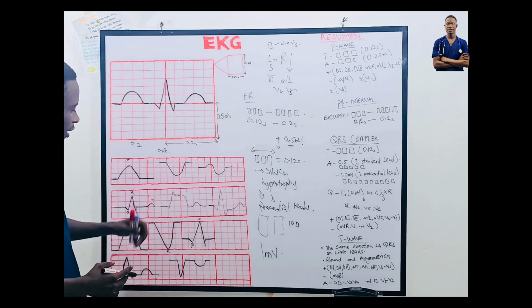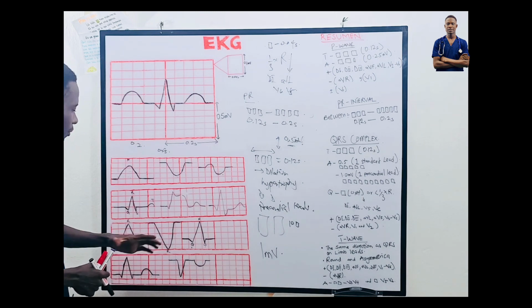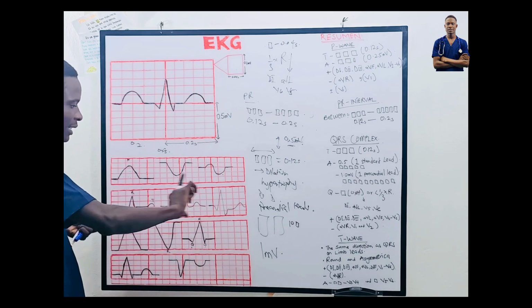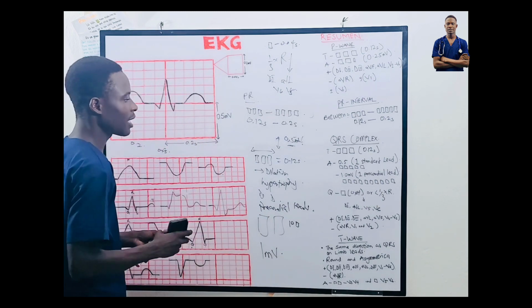Now, from the Q wave, let me also talk about the QRS complex on the leads. It is also different on some of the leads.